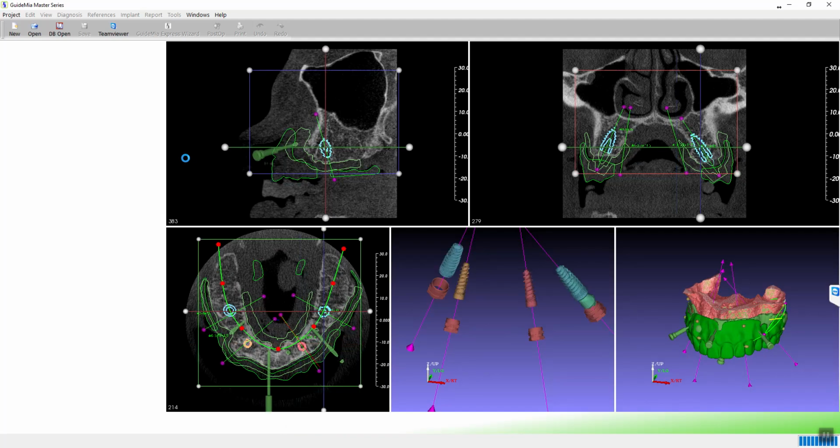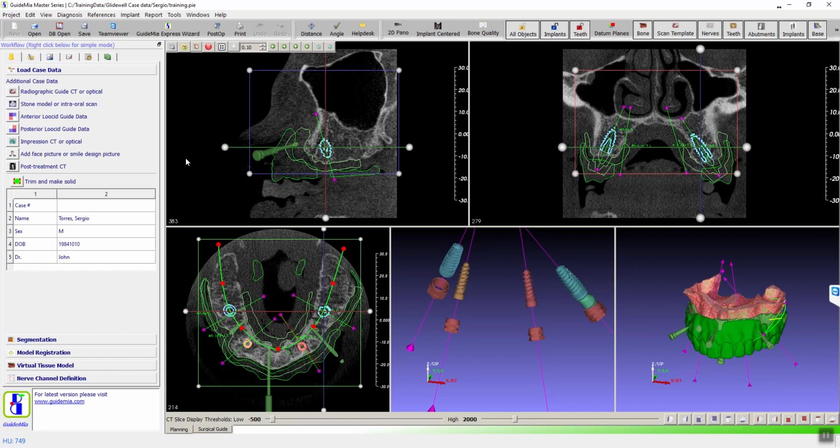So this is a lot more complex than single. Well, actually, it depends. If you don't really worry about the buttons, and don't want to deal with the bone models and all that, then actually it could be pretty quick.